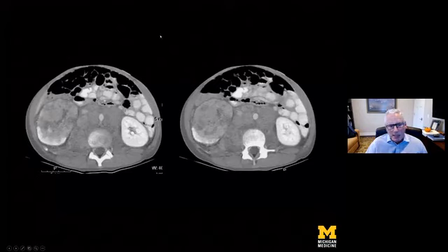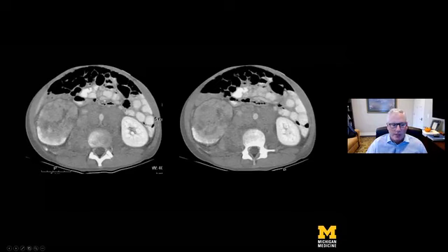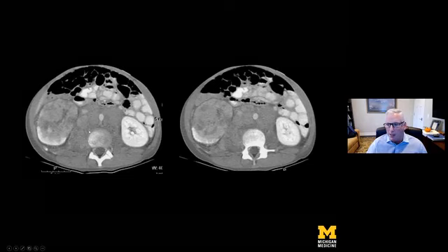Now, this is a CT example. I do not have an MRI example of renal medullary carcinoma in a patient with sickle cell trait, and I would like to thank the Society for Pediatric Radiology for this image. So we see a renal mass, and we also see extensive adenopathy. Now, we could add renal medullary carcinoma, another very aggressive tumor, to the encasement of the aorta category, although it's such a rare tumor, I don't usually include it on my list. But again, this is renal medullary carcinoma. Very aggressive, very poor prognosis.